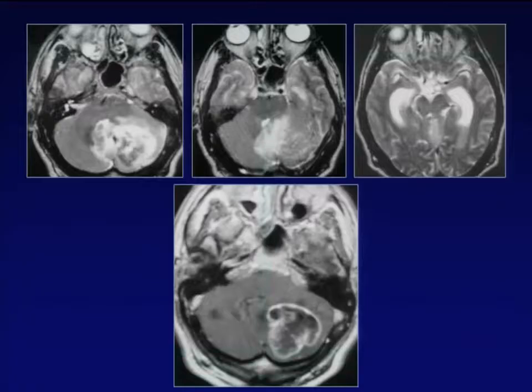In the posterior fossa, it's very important when we are dealing with an adult, as I'm used to say to the residents, the first, the second, and the third differential is metastatic disease. In the posterior fossa, in adults, if we see a tumor, our first differential is metastatic disease, and this tumor is producing, as you see here, displacement, mass effect. You see the signs of hydrocephalus, the dilatation of the temporal horns. This is a case of a large metastatic disease in the posterior fossa.